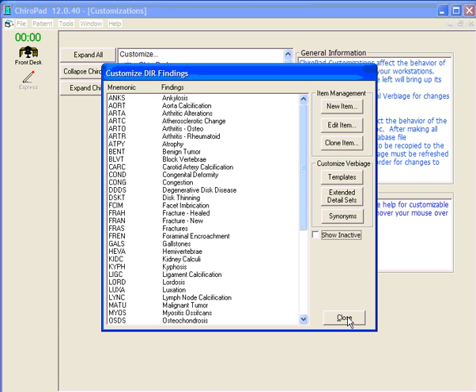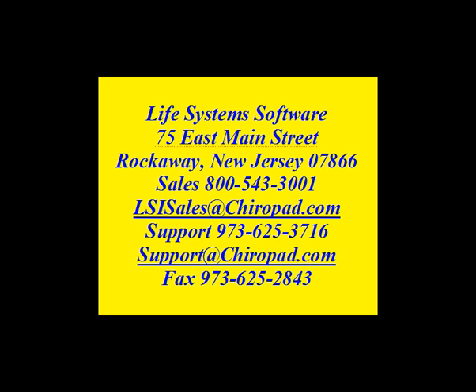As you can see, the diagnostic imaging report is thorough, and it allows you to modify it in whatever way you would choose to.